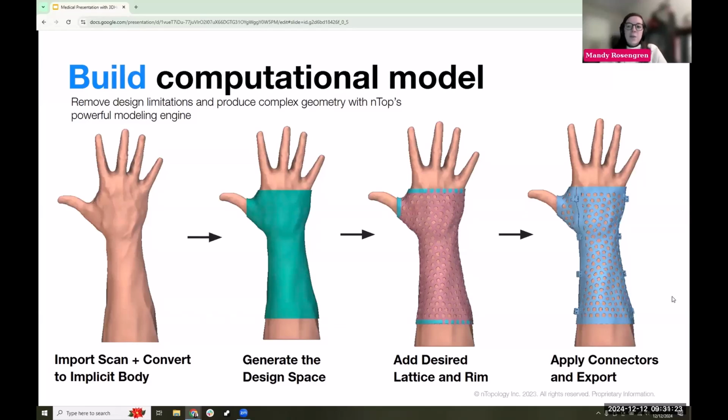might want. And so that we can put this back onto the patient, you can split that model, apply any additional connectors as well to that part. And so this would be kind of that first step. We create our workbook, our notebook, our nTop file.